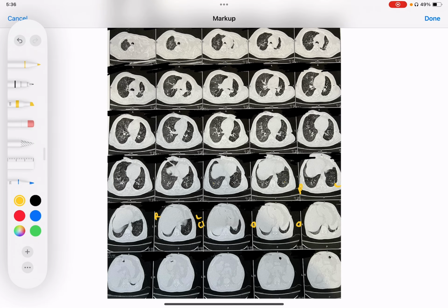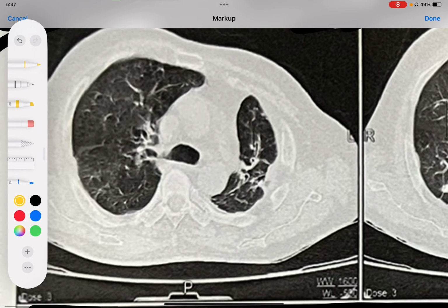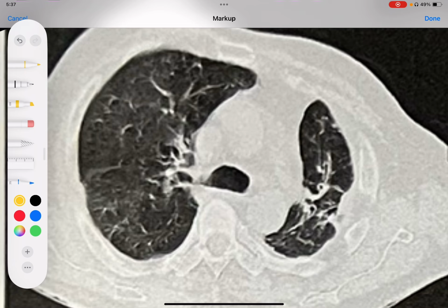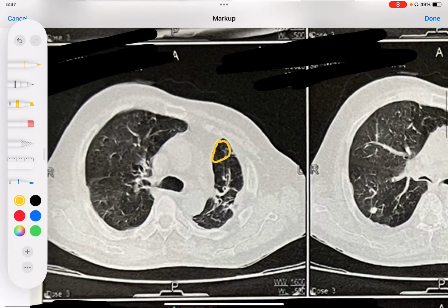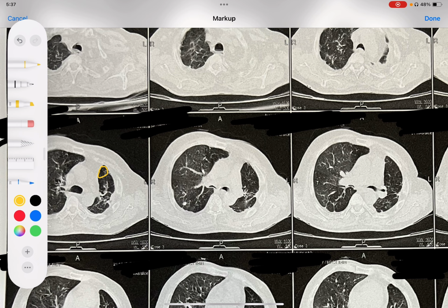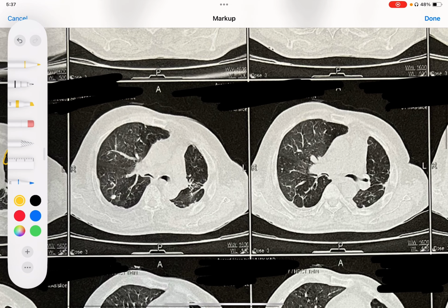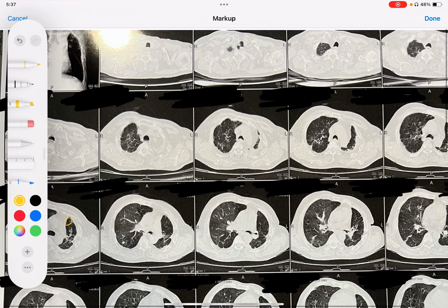Now, we always know that the normal lung parenchyma should be not like this, but still this much we can consider a normal lung parenchyma, where you can see lungs and bronchovascular markings, but there should not be very dense whitish patches or whitish dense fibrotic bands as well. And the bronchovascular markings should be infrequently present, meaning there should not be a significant presence of the bronchovascular markings.